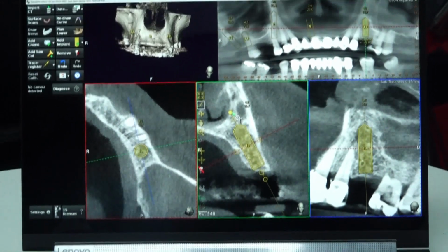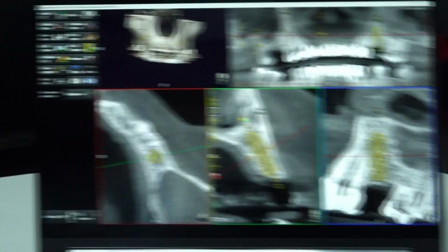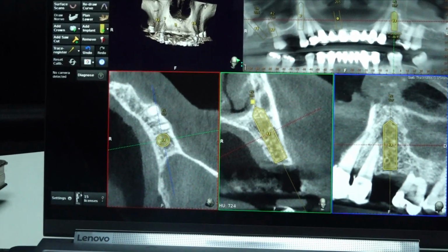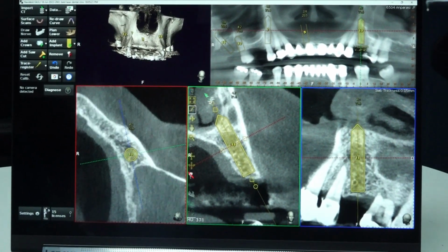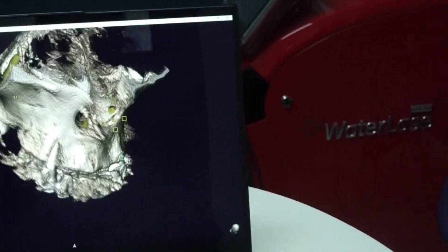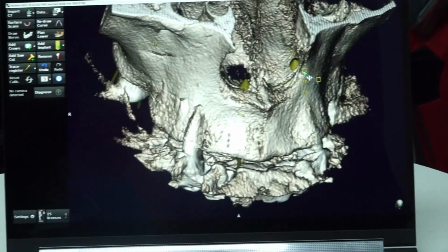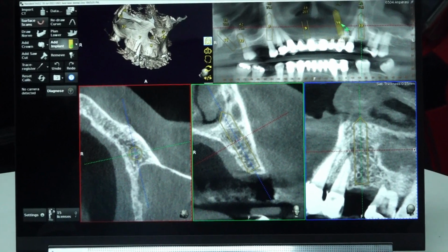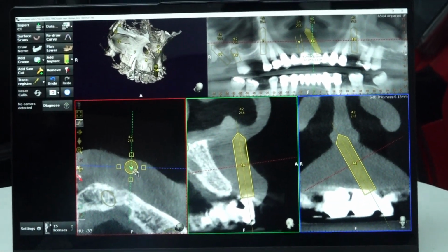Like from home to clinic there is one route. Suddenly if you take a different, unknown route, you may miss somewhere and you may lose somewhere. So here if you just tilt slightly, you are entering the nasal floor, good quality bone, good length bone, you can see here. See, no? Okay, this one implant is good, and another implant. Always plan for 2-1 first. Okay, planning becomes easy.